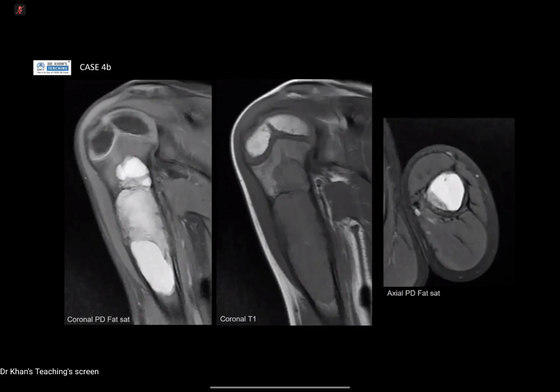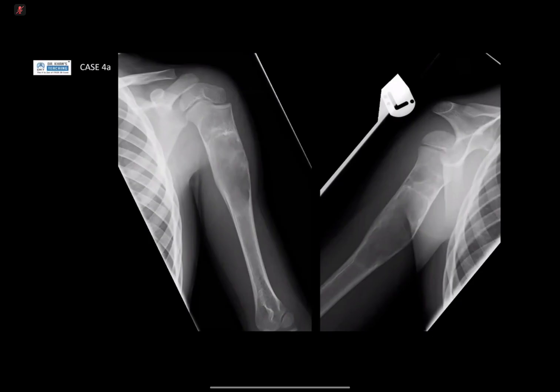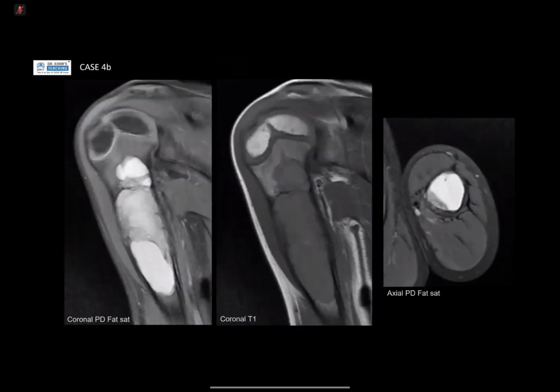The key features are, I guess, it's intramedullary. The one that I've shown you has actually fractured before, which is why you're seeing on the plain film the lateral cortex fractured before within the proximal part of the lesion. And that's why I think it gives that kind of fibrous dysplasia appearance. But most importantly, in a child of this age, in this location, with some of those characteristic findings of a unicameral or simple bone cyst. Now, the layering actually suggests that they've had a previous fracture.